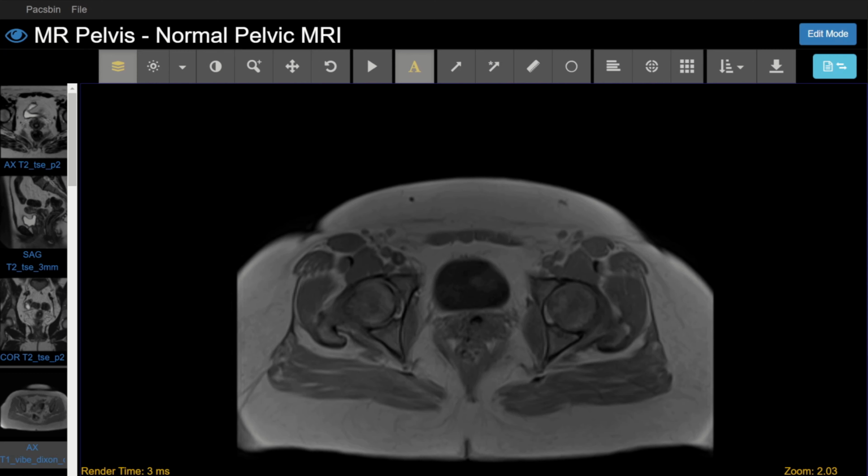First, fat. Identifying the presence of fat in a lesion is very important in Gyne MRI because it completely changes the differential. And we can use our T1 weighted sequences to identify fat. So bulk fat refers to tissue that is mostly composed of fat, like your subcutaneous fat, for example. This is going to be hyperintense on T1 and suppress on fat-saturated images. Notice that on in and out of phase images, bulk fat is hyperintense on both. There's often India ink artifact surrounding the bulk fat on out of phase images.